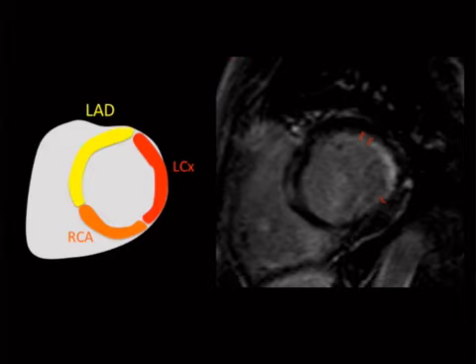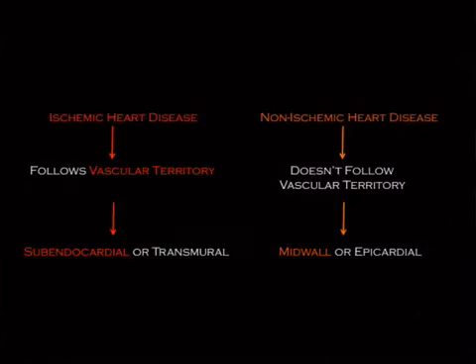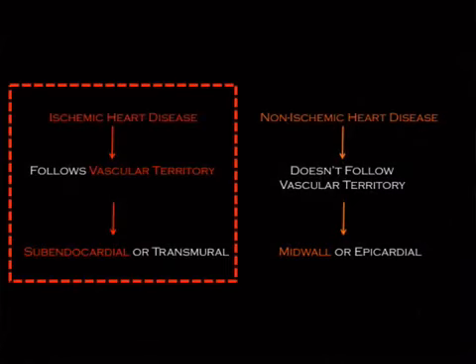They could straight up ask you what vessel was involved in that. That could be part 1, part 2 could be, is this ischemic or not? That would be easy. So obviously it's ischemic. So zooming up here, that is indeed subendocardial, just like I said, and that's going to make this ischemic, right? It's following vascular territory and it's subendocardial.